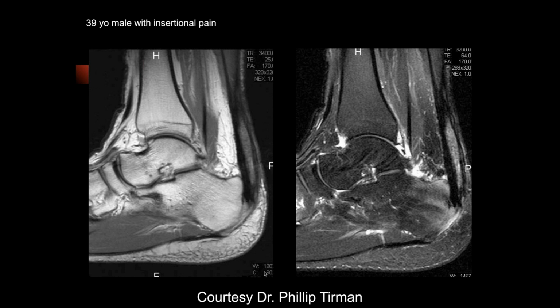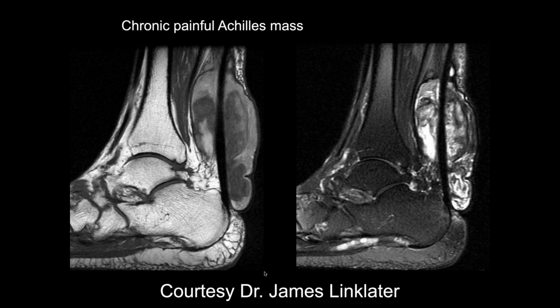John, would that be tophus that Jennifer was talking about? I don't know that I'd call these tophi. Tophus usually in it. I'd call this gouty tendinosynovitis, I think.